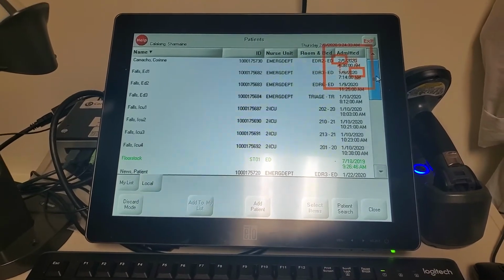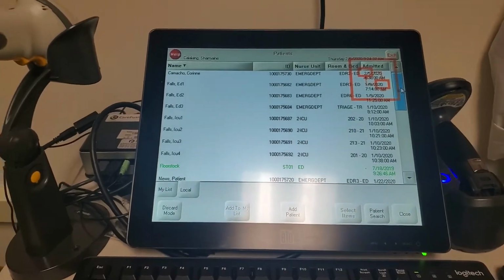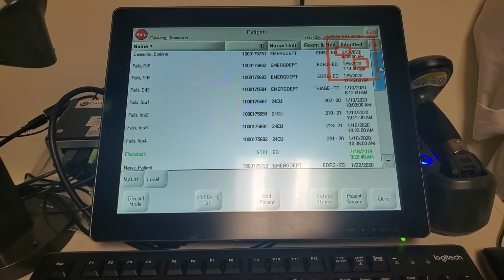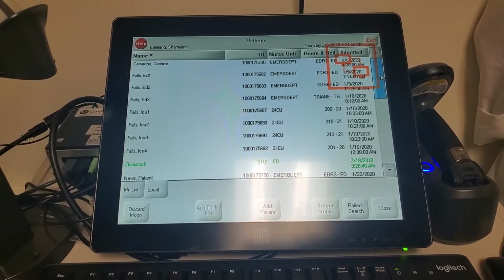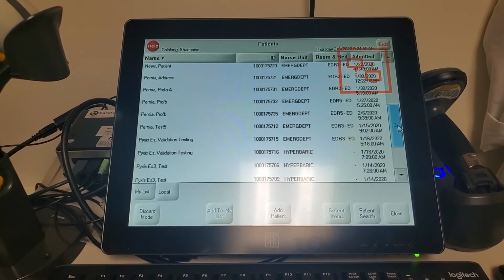In addition to that, if your patient is in ED and you're here in Tele, you can't see your patient unless you have the power user to see all the GRMC admitted patients. Whoever's located in MedTele or in this location, that's the only patient you can see on your screen, unless you are a power user. Yes.